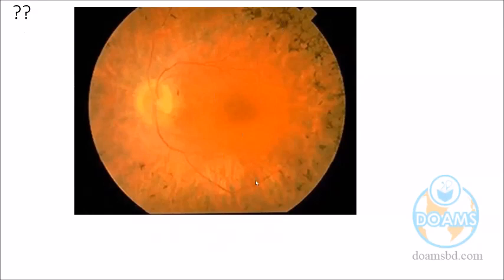What is the appearance looking like? Retinitis pigmentosa. It is clear to you because there is a peripheral bone spicule appearance of the pigmentation. So is it involving only the retina or the choroid as well? What do you think? Is it the deeper layer or the superficial layer? It could be the deeper layer. Otherwise, why is this black? Yes, sir, the deeper layer of the retina.